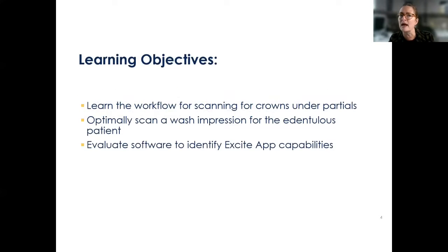So we're going to learn about the actual workflow for scanning a crown under a partial. And Brenda's really excited to share her preparation experience. You know, we're working on typodonts and not with real handpieces, so it was a fun adventure for her preparing for tonight. And then optimally how to scan a wash impression for an edentulous patient, and that will be a hands-on demonstration as well.